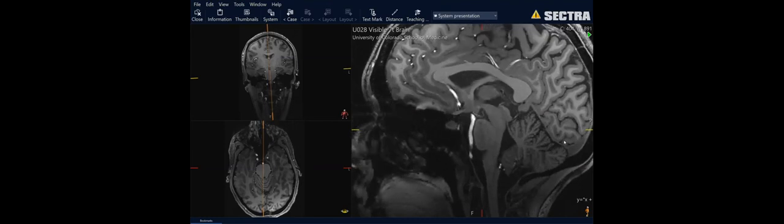All right. Anterior cerebral arteries coursing above the corpus callosum. Recall that cingulate gyrus immediately above the corpus. Tentorium cerebelli, and this here is that great cerebral vein of Galen. So internal cerebral vein going up, and then lateral, of course, the basal vein.